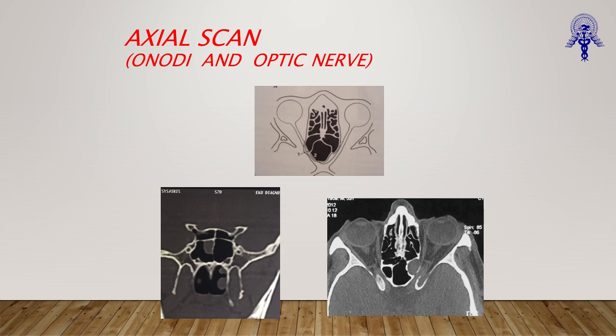Posterior cells extending to the sphenoid sinus. Okay, so it is a posterolateral extension of a posterior ethmoidal cell beyond the confines of the anterior part of the sphenoid sinus. Okay, here the anterior ethmoid and posterior ethmoid sinus end here, but this has gone beyond this sphenoid sinus, and here the optic nerve is lying dehiscent.